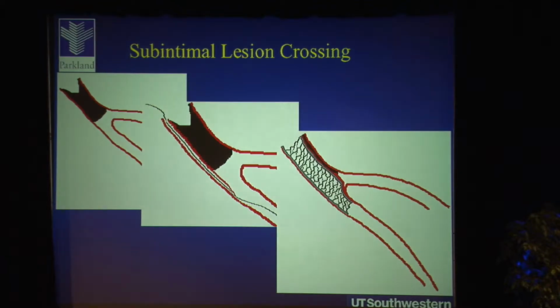And so what's the problem with an antegrade dissection strategy here when the distal cap sits right at a point of bifurcation into an important side branch? And this is a crude drawing, but it illustrates the issue here: if you try to tackle this in an antegrade fashion and your reentry is distal to the bifurcation, then with angioplasty or stent implantation you would potentially compromise access to your side branch. And this one, I would argue, would be an important side branch vessel.